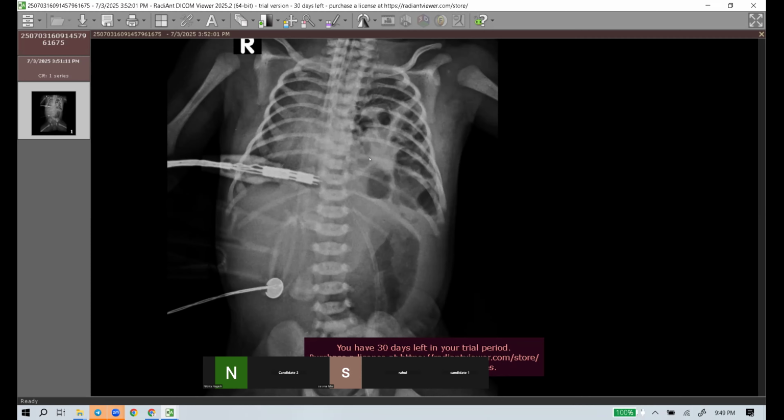And another thing is, when you get a radiograph and you know the diagnosis and findings, it's better to come in and out. What I mean is, for example, when you are describing the lucencies, don't come out. Describe this completely. What is the lesion doing to the parenchyma? What is the surrounding doing to the lesion? Finish that completely and see what is happening. Then you come out. Then you start seeing the right lung and all, because they are also bothered with approach.